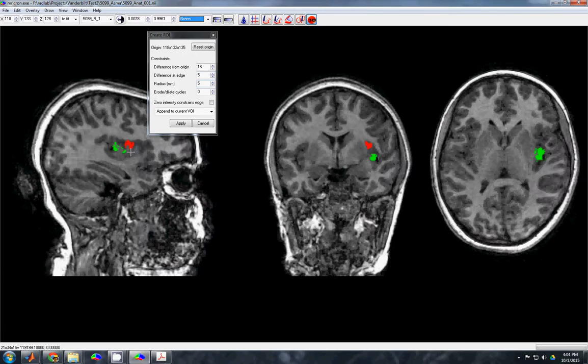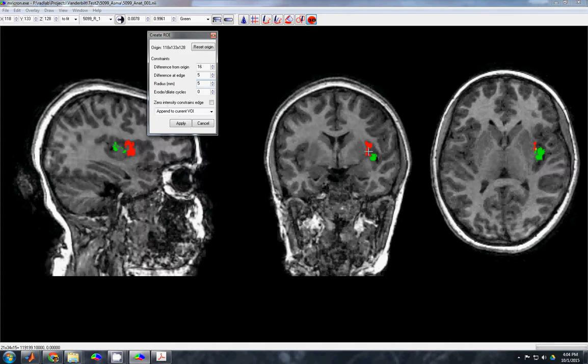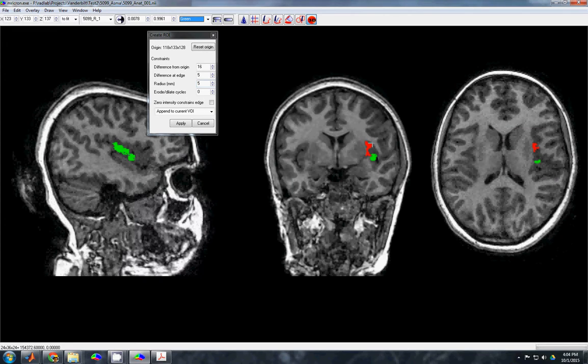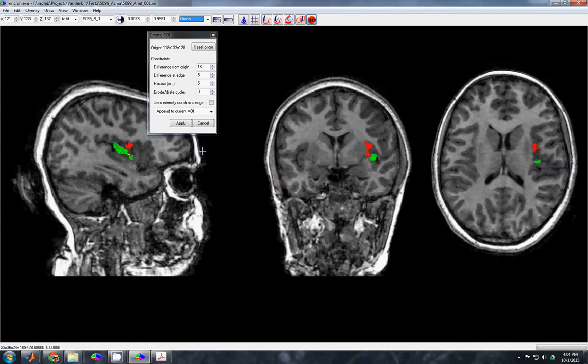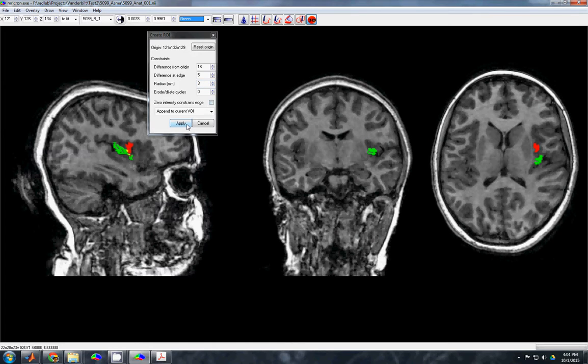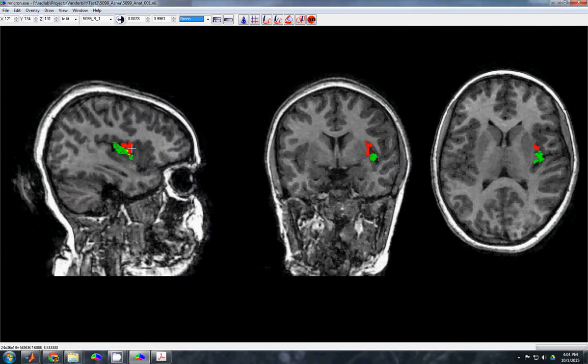Not bad. This could kind of go under a little bit. Maybe it looks like some gray matter there. Looks okay on my coronal. If I scroll outwards, it looks like it doesn't totally survive out there, but every time I press 3D, it's going to try to extend, and I want to try to avoid overlap. That's why it's nice to have the overlay there again. And you can see now in the different views, I'm really getting a nice blob here in this middle insula. So this is going to be my region number 2.